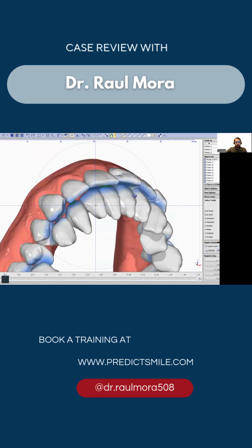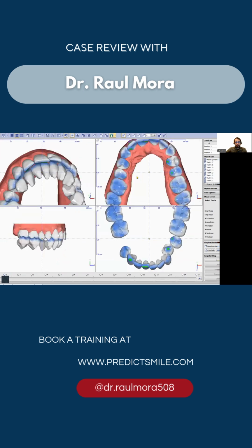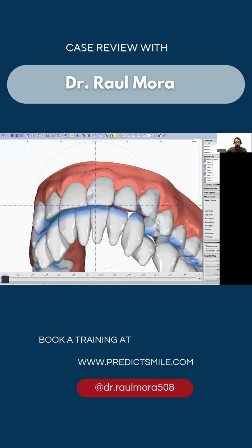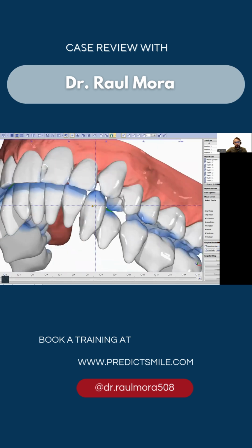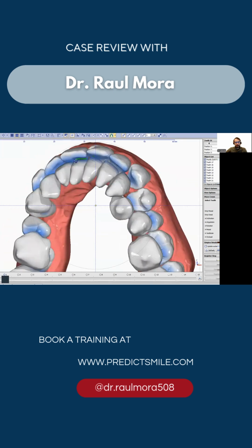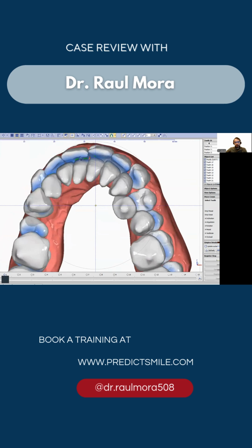I will start with the upper arch because we have some contacts here. As you can see, we have only contacts in the anterior segment. And this contact here, in the previous case, they tried to fix this crossbite. Now the doctor is just requesting to work from 2 to 2, from 3 to 3, sorry, anterior segment.